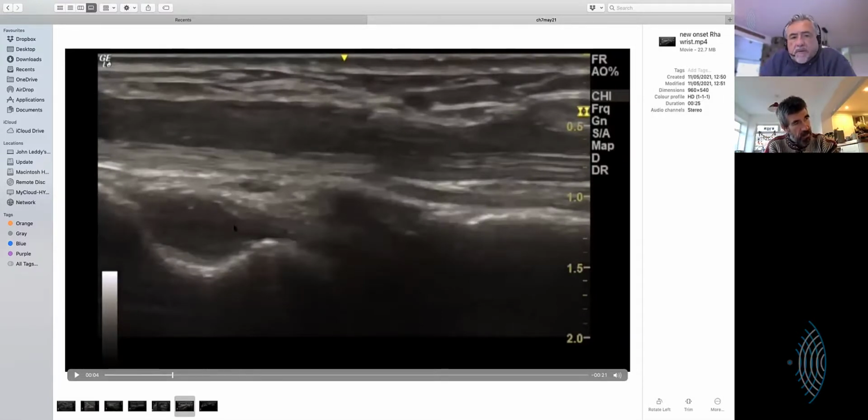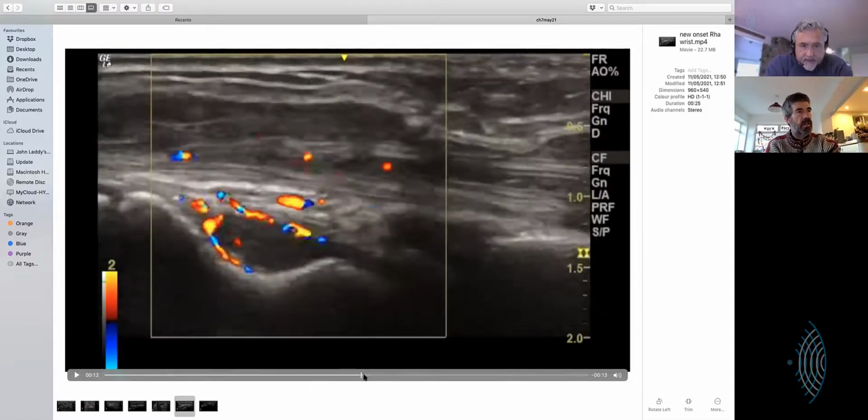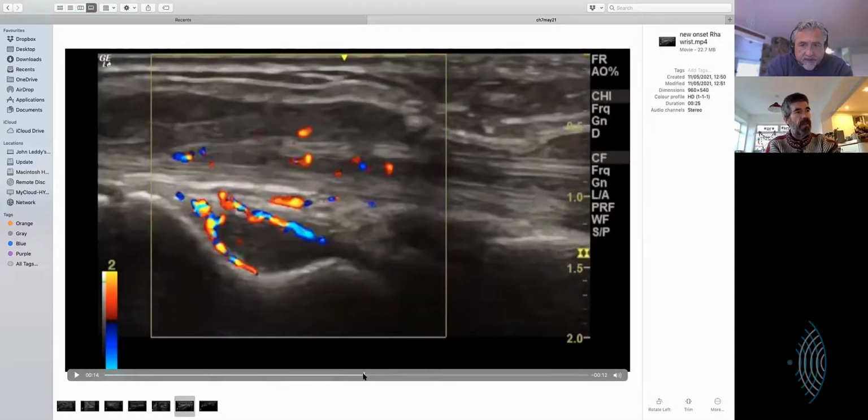Okay. No, it's not following. If you have got anything there, it should follow the contour of the capitate, whereas this balloons up, it has a swollen look. Okay. Man, I'm not good at recognizing that topography to know my landmarks down in that wrist.